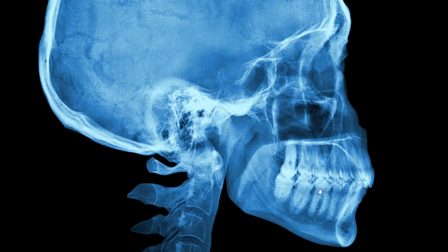So if you have a cavity in a tooth, it'll appear as a radiolucency. Superficial cavities may be treated with a filling. Usually if you have a lucency, a cavity that extends into the pulp chamber, this is more problematic. The dentist will offer a root canal or an extraction once you have a carious lesion that gets that deep.